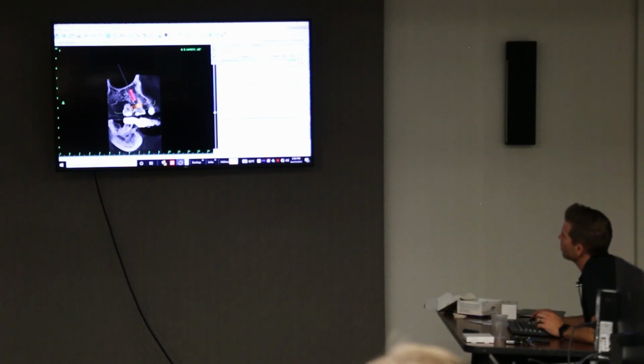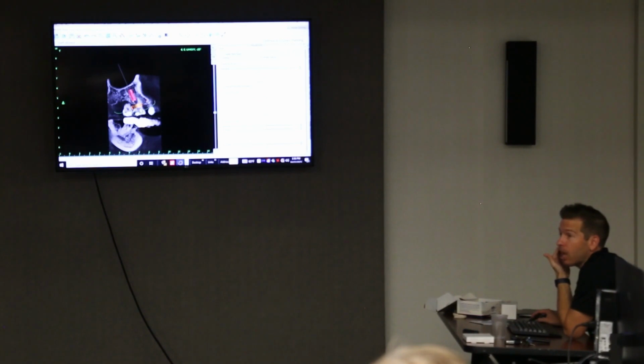So do you see right here this green line? That's where my model is, and that's where I need it to be, below that guide tube. So once you have that hint turned on, if you guys see in model editing, the very bottom of model editing is called the Model Outlines Editing Tool. So I can actually manipulate my outline and it'll manipulate my model.